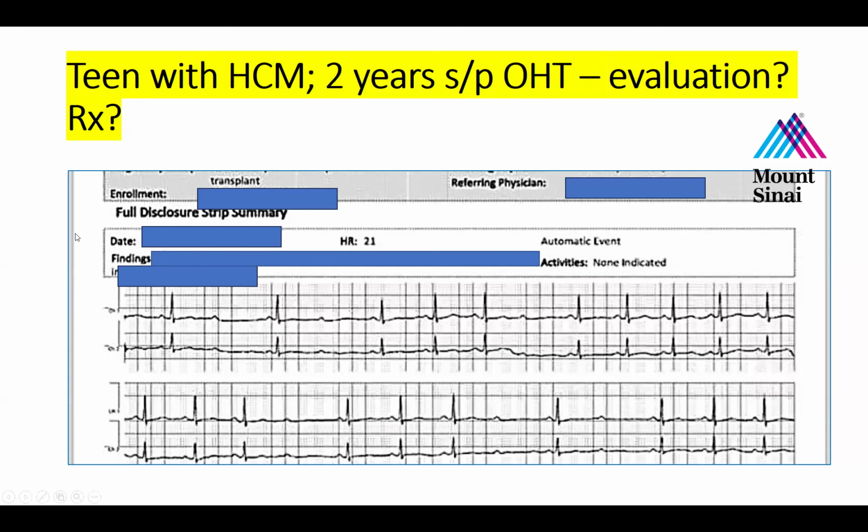Okay, so do we normally transplant hearts to recipients that have heart block in them? In other words, if Molly Marshall, let's fast forward 5 years, Molly is our third transplant cardiologist at Mount Sinai, and she's on call for transplant, and she gets a call that there's a heart available for one of her patients, and this is the tracing from the potential donor.